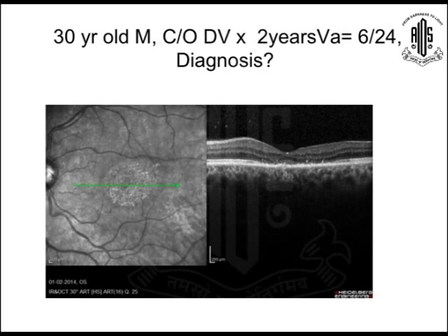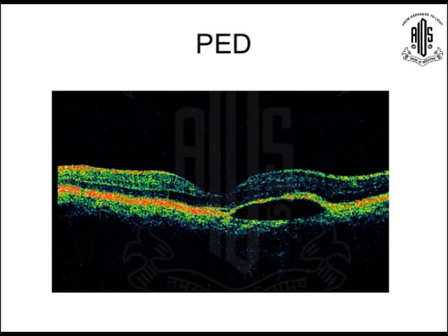So this patient came with a nicely round macular dystrophy-like appearance, and this is a 30-year-old, you can see 6/24, and in the OCT you can see there is small fluid which gives a diagnosis of CSR, chronic CSR definitely. You see the junctions which are there nicely, and here it is destroyed, the RPE also. And there are some of the OCTs we are going to show.